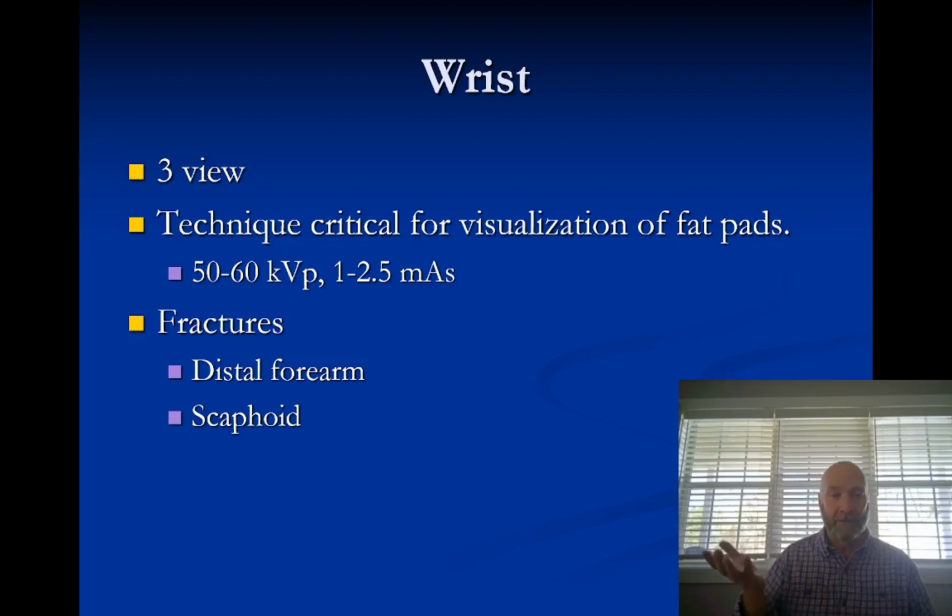We're going to see an increase in kVp levels because this was kVp for screens and films. It doesn't really apply in a digital world. 60 to 65 kVp is probably where you're going to live now because kVp doesn't control your contrast anymore. It's your computer algorithm.